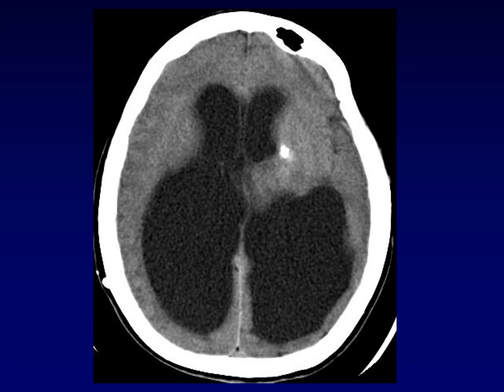This is a disease called hydrocephalus, in which the ventricles become enlarged. Now, wait a minute, you're saying to yourself. You just showed me a couple of pictures of a 19-year-old and a 90-year-old brain, and you said it's normal. So why is it that this patient with large ventricles has hydrocephalus, but that 90-year-old with large ventricles doesn't?